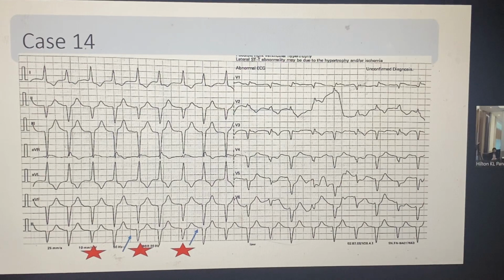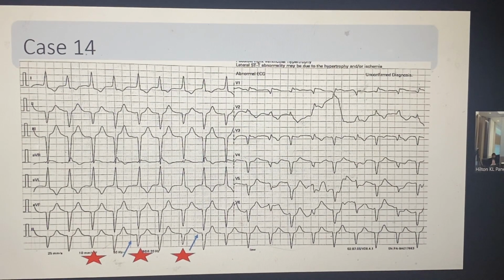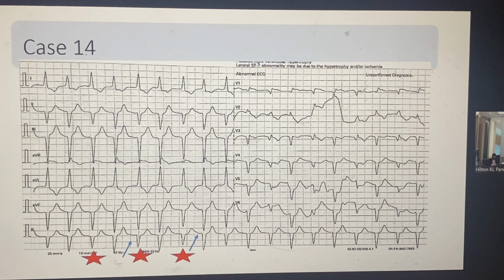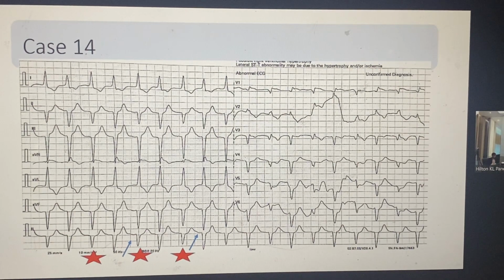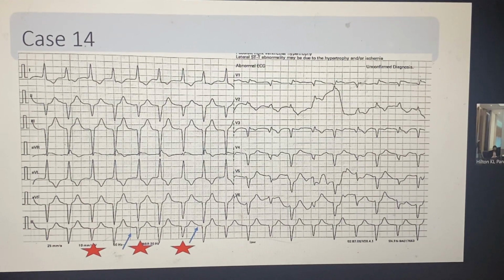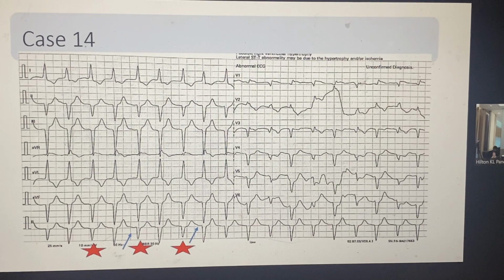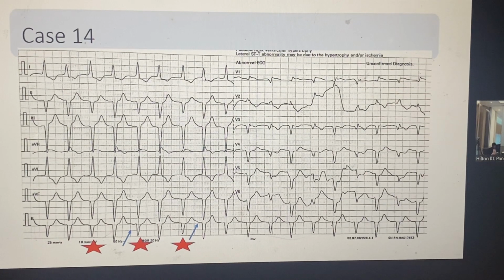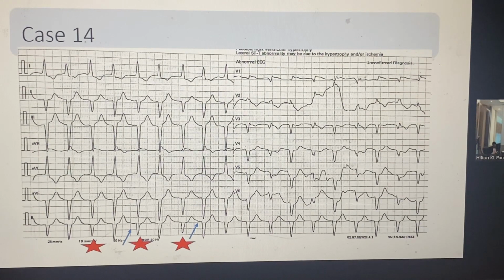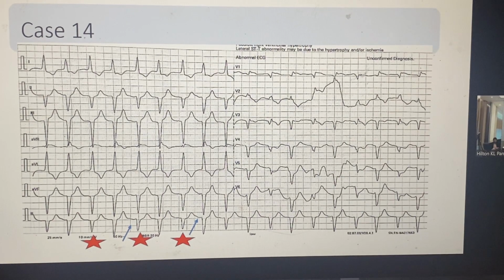You can say that the rate is slow because in scar VT, you have the scar there to re-entry around. But again, the most important thing, if you have doubt in this type of unstable, broad complex tachycardia patient, you need to put VT as your first diagnosis, because AIVR is most of the time nothing, but VT you need to do something.